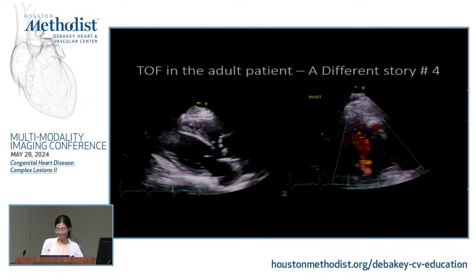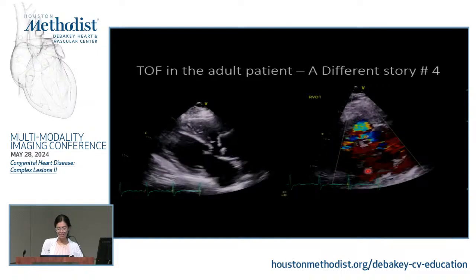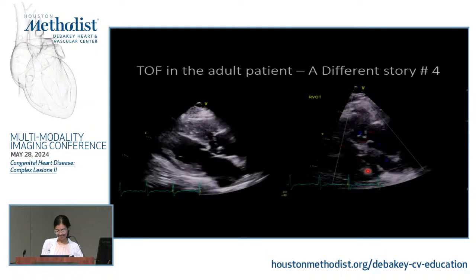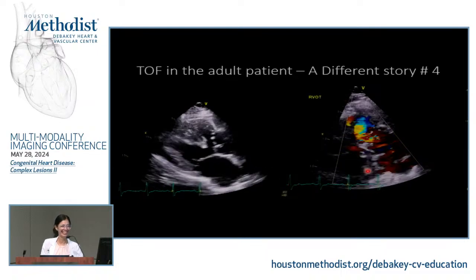Because I would expect the aorta to be on the other side, right? Alicia, do you want to help him? I can tell you because I know this case.